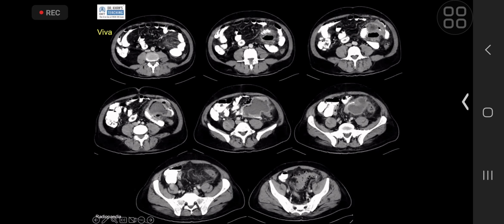Now, diverticulitis is also important for barium examinations, which still come in the exam. So I warn you on that. Your generation, you don't do bariums and you will always struggle on that. This is a classical exam film where you can see a bit of diverticuli here and here and here. And with that, there is a rectovaginal fistula. So let me go through the case.